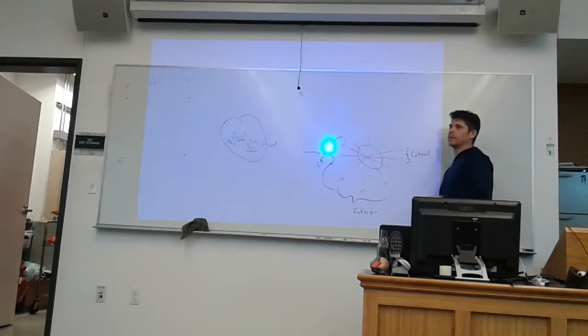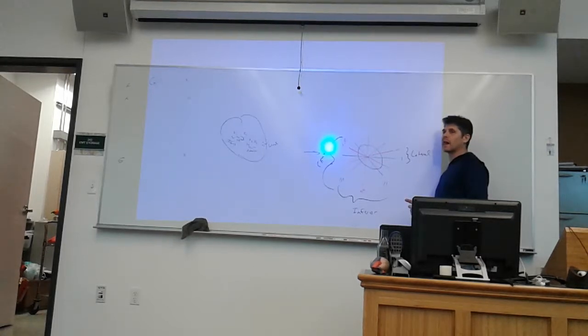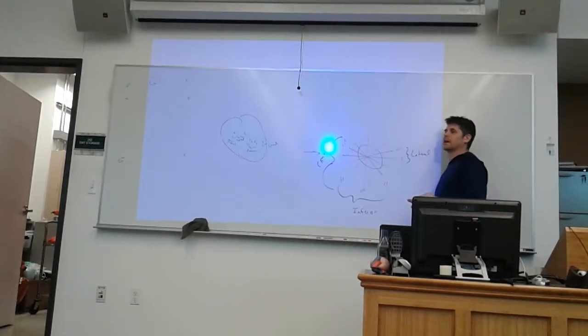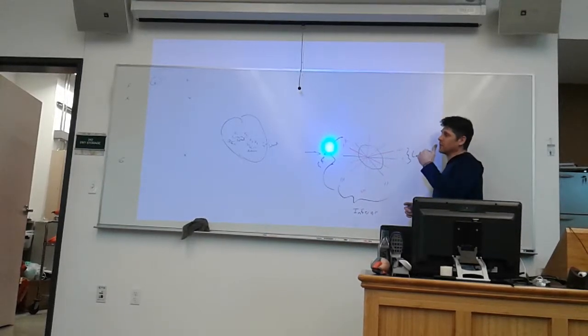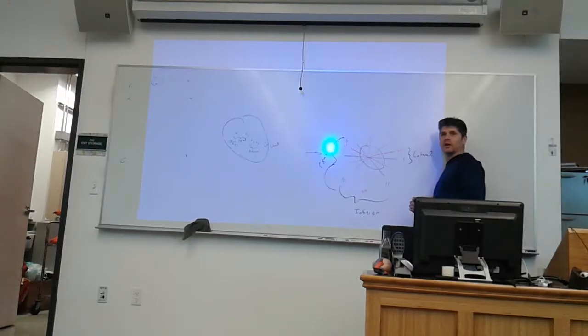Which leads would be the most logical to let us see that there might be something with the posterior? You say it's not represented at all, but we can get an idea of what it looks like just by the leads that we currently have, because it's seen all the way through the heart. Absolutely. So I'll re-ask my question, which Chandler is asking in a different way. The posterior is not represented by a direct camera, right? But which leads give us the best clue of what might be happening in the posterior?